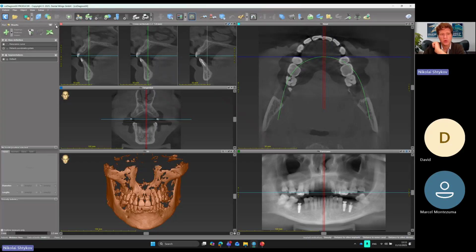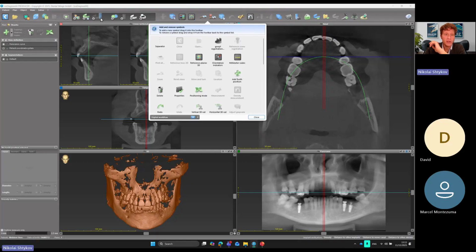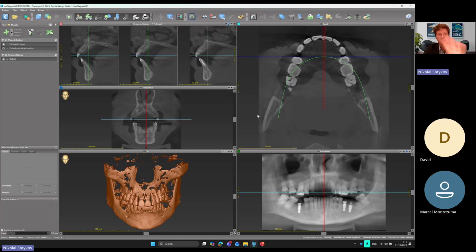Also, you can see the steps 1, 2, 3, 4, 5, 6, 7, 8. So, if you like, you can click adjust and reorganize this if you don't like the workflow and, for example, want to have AI assistant in the first step. So you can reorganize it by yourself. I will keep it as default.